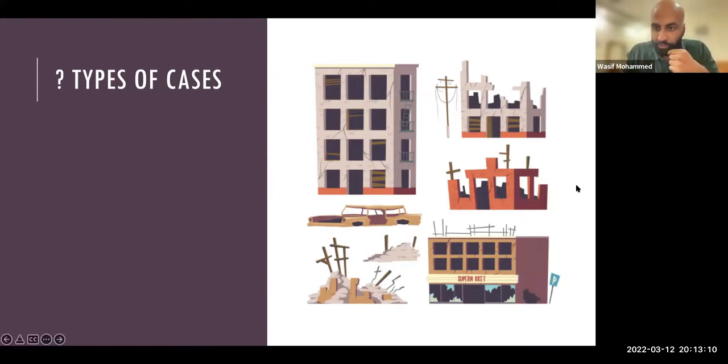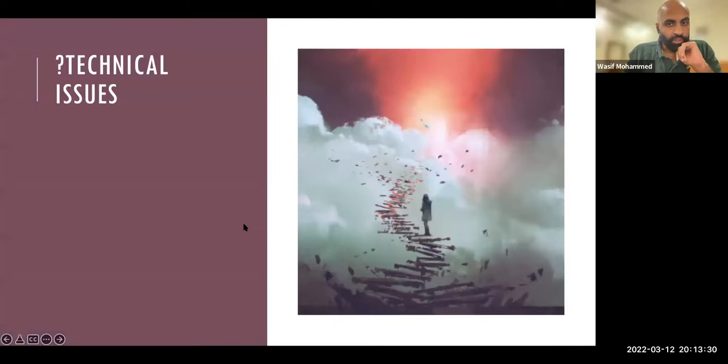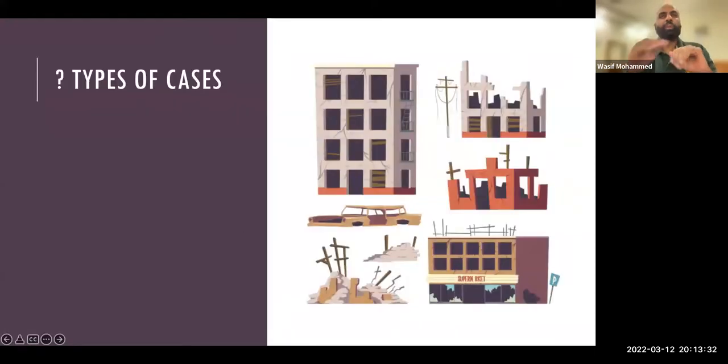So we have a question. The question is, can we scroll the CT a few times until we reach a diagnosis? I think 2 is the limit. So you go up and down, and that's it. You need to start talking. Okay. Another thing that I want to tell you guys is, sorry. So let's just get back here.